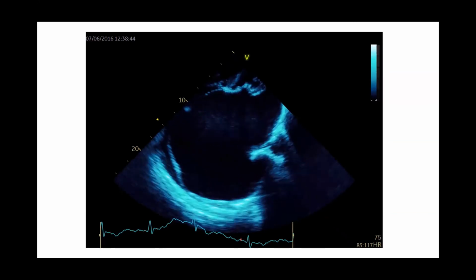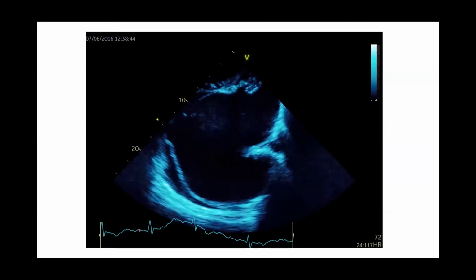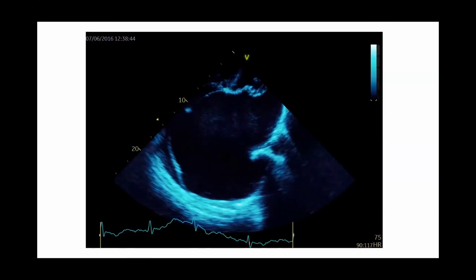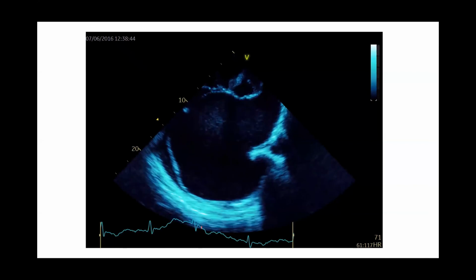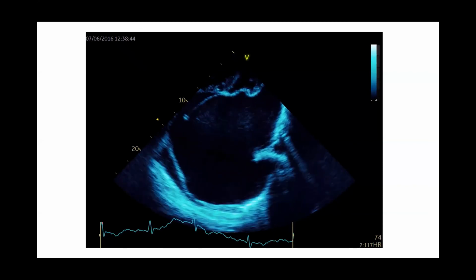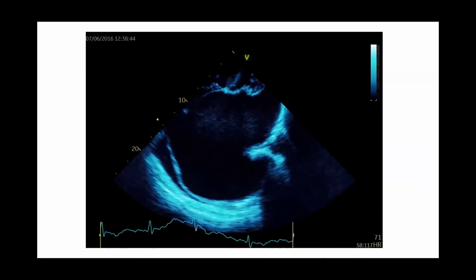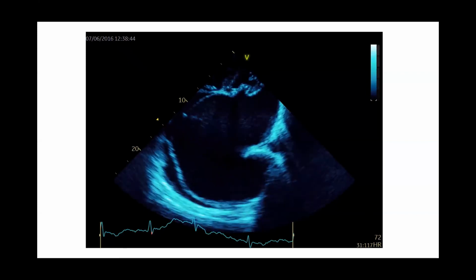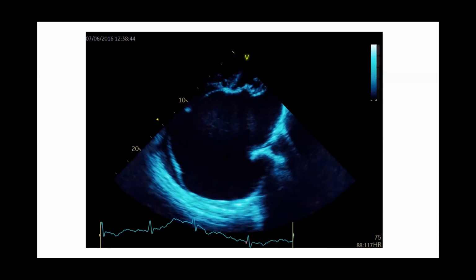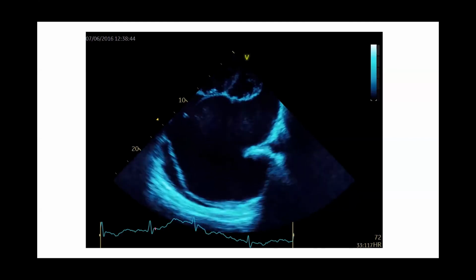So yeah, massively dilated left atrium, as you can see, with some spontaneous contrast in the left atrium, resembling low turbulence and low flow. Probably can almost see the left atrial appendage in this. Yeah, people say that you can't see left atrial appendage on transthoracic echo. You can. Yeah. What's the line within the left atrium towards the bottom of the left atrium? That's the boundary of the left atrium. All right. Mm-hmm.